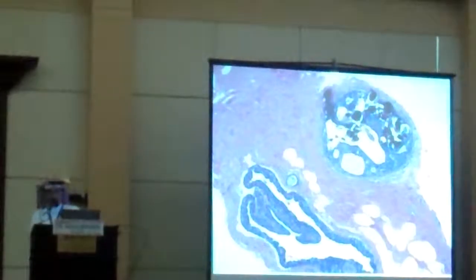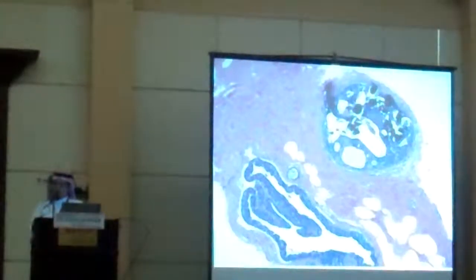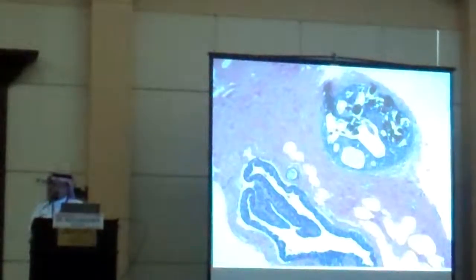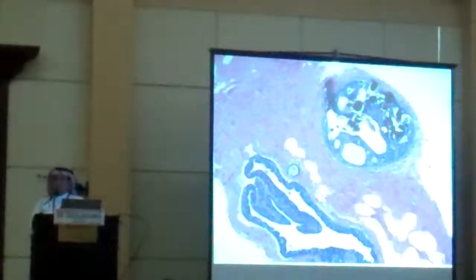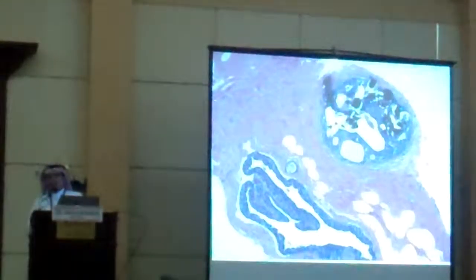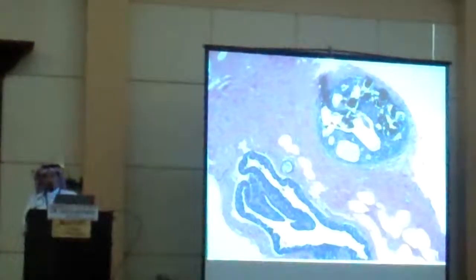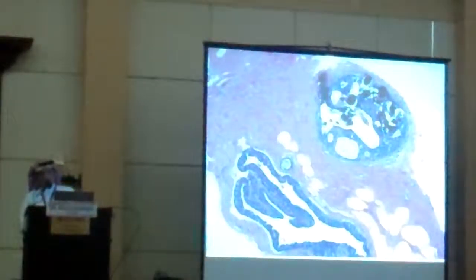We see it luminal. And I'm really quite happy that Professor Abdulmohsen mentioned that. She would like to know where the calcification is. Is it luminal, stromal, or is it clusters? I usually don't mention this, and the people that I was trained with don't mention it, but I think it's a really good idea to mention it. I'm going to do it from now on.